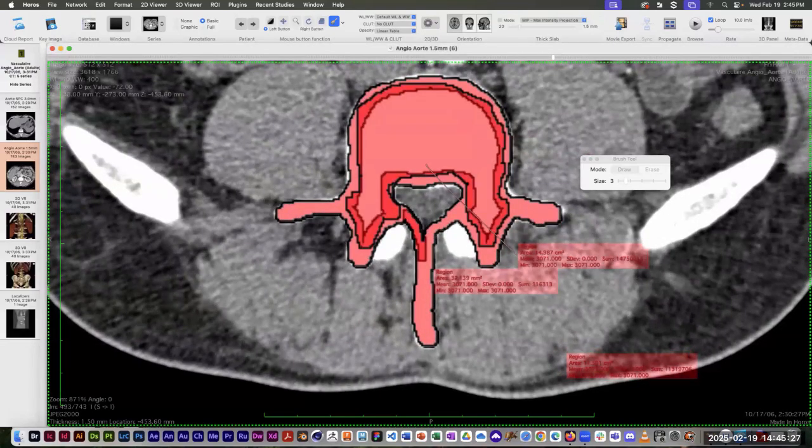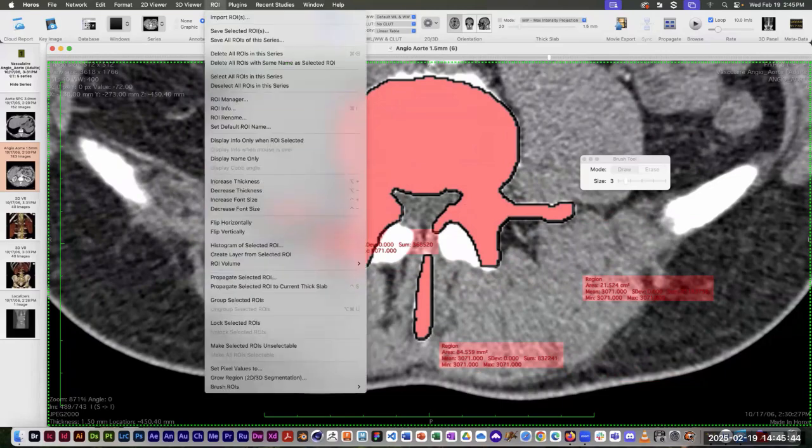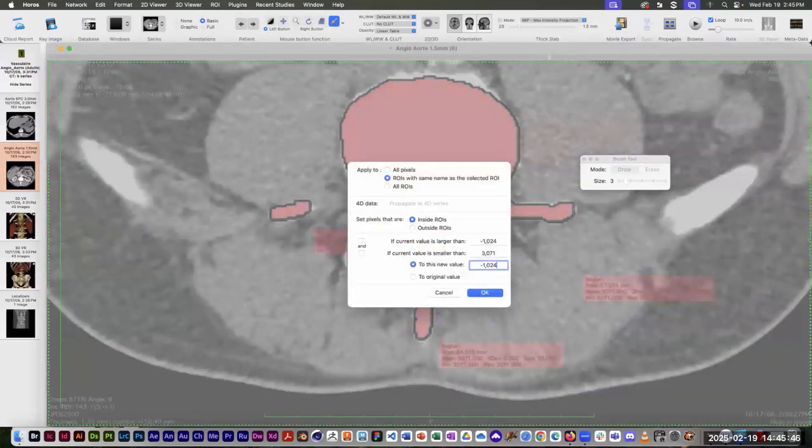Now, here's where I have multiple overlapping regions of interest, but it doesn't matter. The fact that it looks sort of uniform pink back there means that the image in the background has turned pure white.